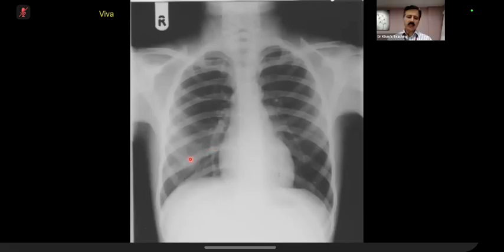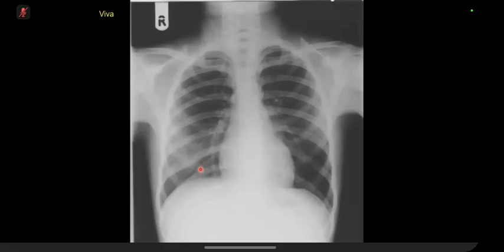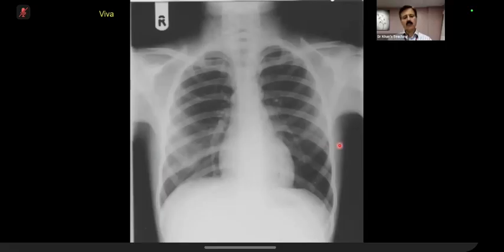So I'm concerned about... Do you think this rib is normal, where I'm pointing out? No, it's not normal. It appears to be expanded, it's sclerotic. It looks like it's infiltrated. Do you look at this soft tissue versus this soft tissue, any difference? Yes, on the right-hand side, the soft tissue is increased.